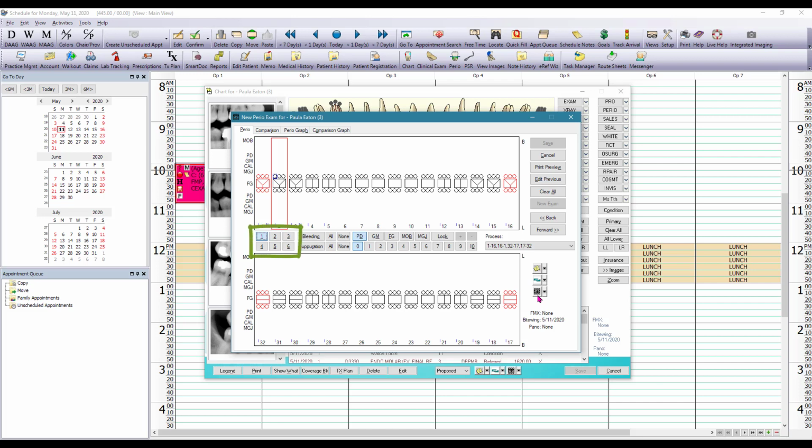Over here on the left-hand side, the 6 number boxes you see each correspond to a pocket. So instead of having to click on the tiny little dot, you can just click on the tooth number itself and then navigate through the dots, aka pockets, through these numbers over here. The numbers 0 to 10 are the numbers that you are going to use if you are using a computer mouse. Otherwise, you can just use the number keypad on your keyboard.